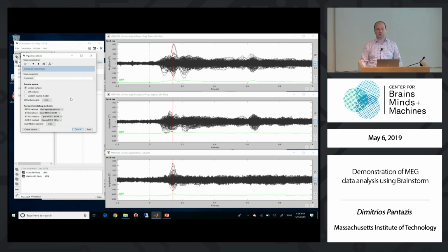I would point you now to the excellent talk from Adi Hammerleinen about the estimation of forward and inverse models. And you may have thought, like it's really complicated and so many different methods and so on. They are actually, but the work has been done. So what you have to do here is only click a button and then you get all these things. So we will compute the head model. It will be constructed by an overlapping spheres model, an analytical model. So computations will be immediate and accuracy is really, really good.